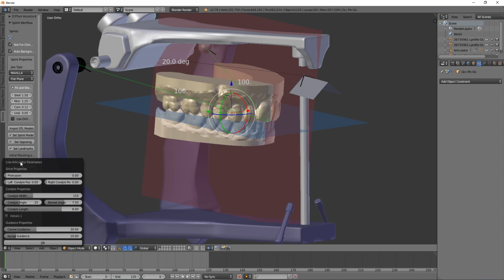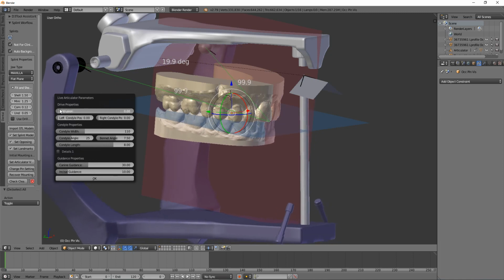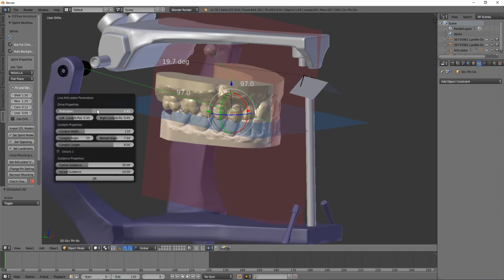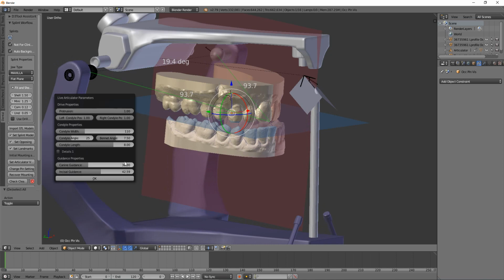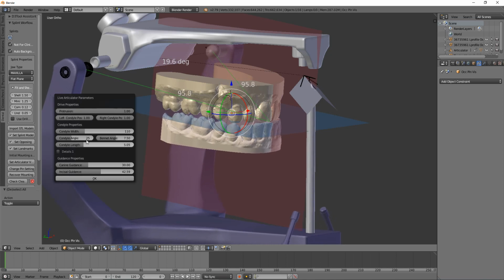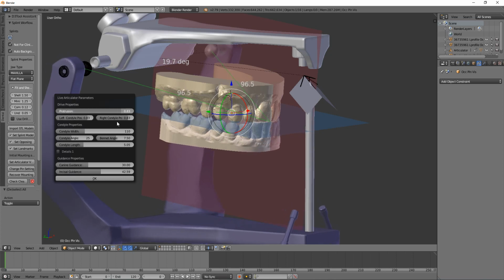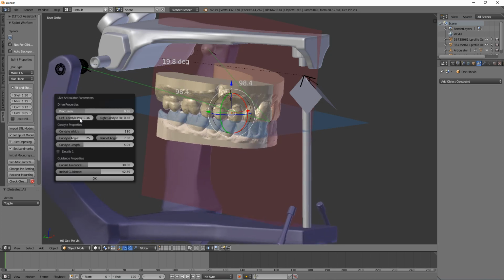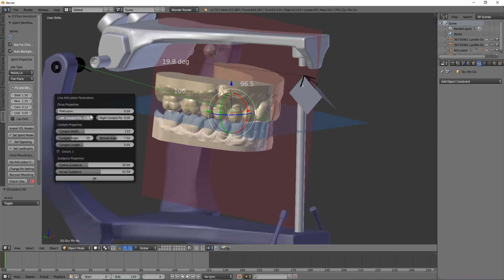is we can now drive our articulator. Okay, we can drive down here, and then we can change things while we're in these manipulated positions. So here I'm setting my guidance. I might also drive the protrusion all the way forward and then decrease my condyle length, thereby decreasing the overall distance that the simulation is going to happen on. So here I've kind of set my range of motion. Then I can just drive one or the other condyle, and I can adjust my canine guidance.